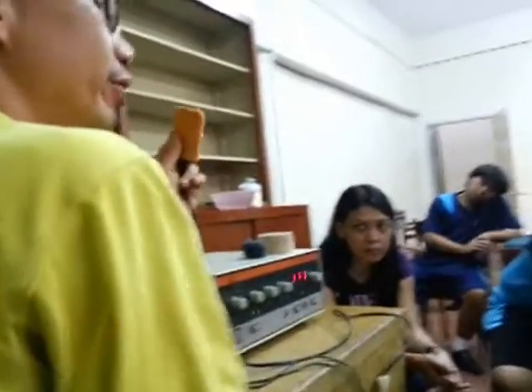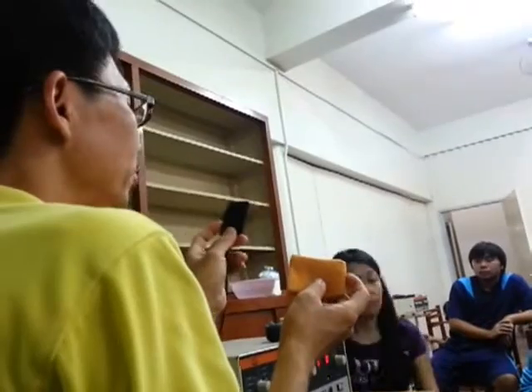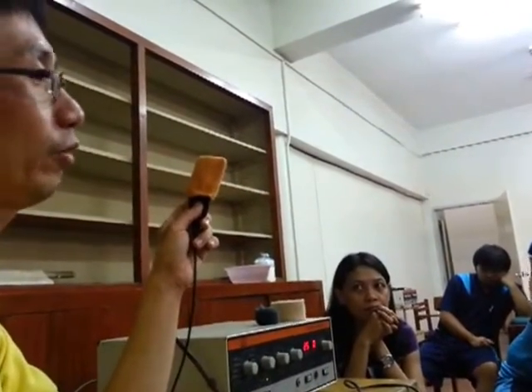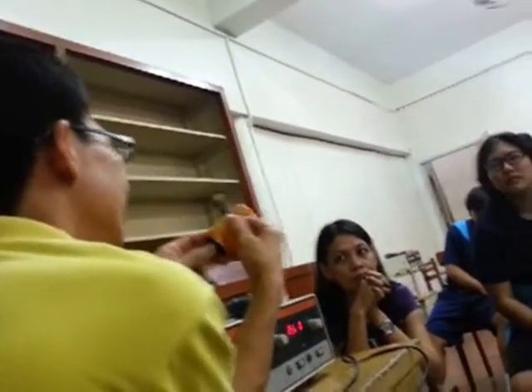Electrodes can also be of different sizes. This one is small. Later on, another size of electrode which we're going to encounter is large. We still have what we call a pen electrode. A pen electrode is small, with a point. If Miss Janice mentioned motor points, they usually use this for motor points to stimulate the area where the nerve is expected to be.